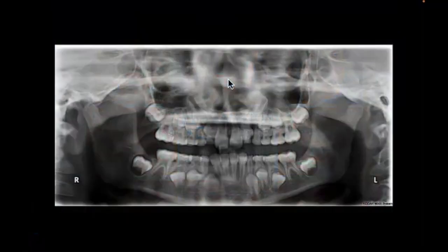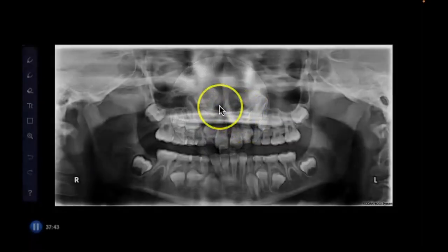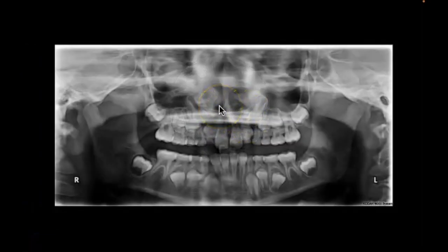Let's look at our pano now. Does this shed any more light? Right? Now what are we thinking? What are we worried about when we look at the pano? What are some things that stand out that's like, oh, that might be a concern? Of what specifically? Which canines? Yeah, right? This doesn't look great. And so we talked about the narrow jaw possibly being one of the reasons that this might happen. What other thing do you notice in this image that might be like, oh, dang, like maybe that's affecting it as well, that you couldn't really see in the other images that now you can see?